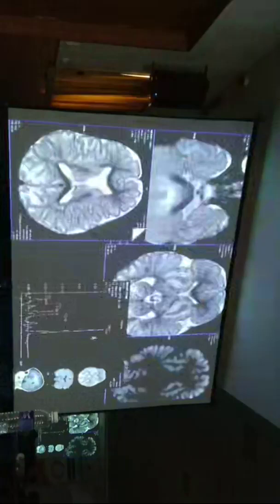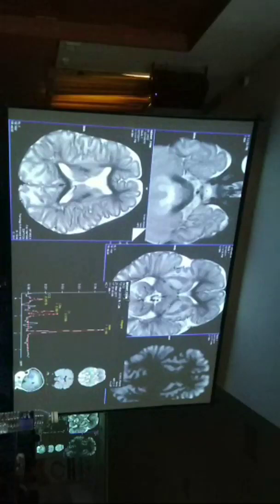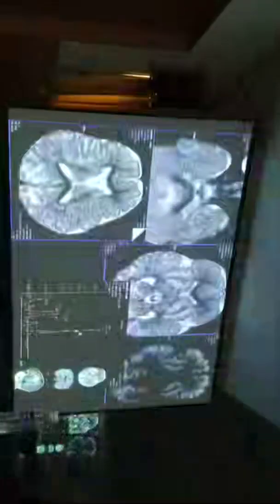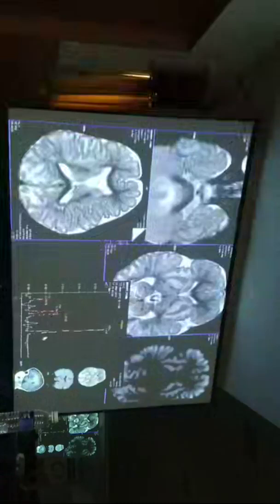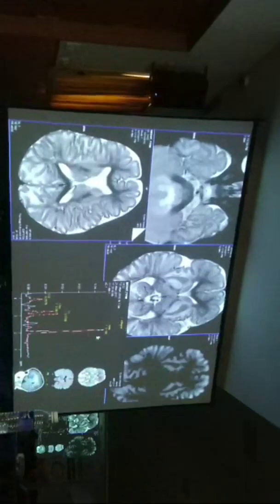This is an example. This is a patient who is 1 year old. What is this? At 1 year old, subcortical white matter is involved. Canavan, very good. At 1 year old, you may not get this much NAA. NAA is actually lower. At 2 years only, we get the adult pattern. Before 1 year, the NAA is the smallest peak. After 2 years only, we will get an adult pattern. At 1 year old, if you get an adult pattern, that tells you there is an increased NAA.